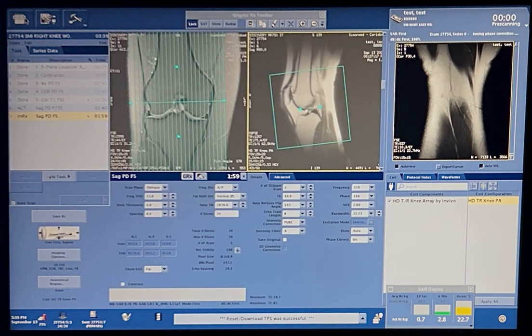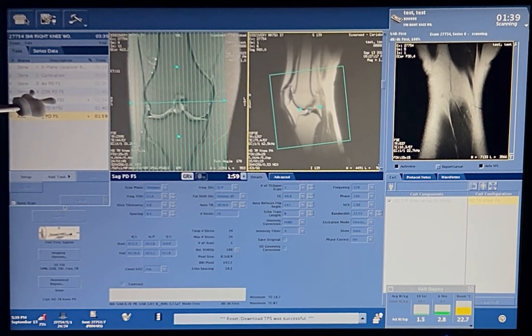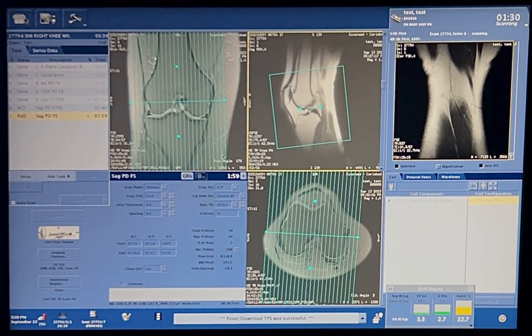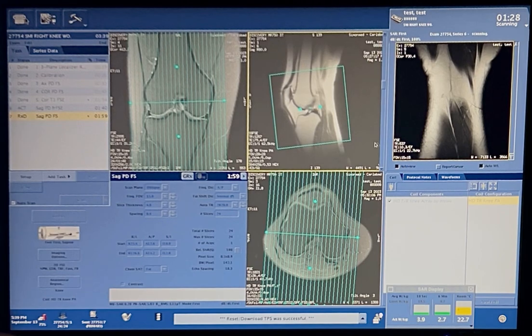Okay, so you can say it's all good. It's a PD. You only really have to worry about T1s and maybe T2s for TR ranges. That's what you should primarily worry about. Don't get me wrong, you should always check it. But T1s are the most susceptible to being out of range. Okay, so take me to the viewer.